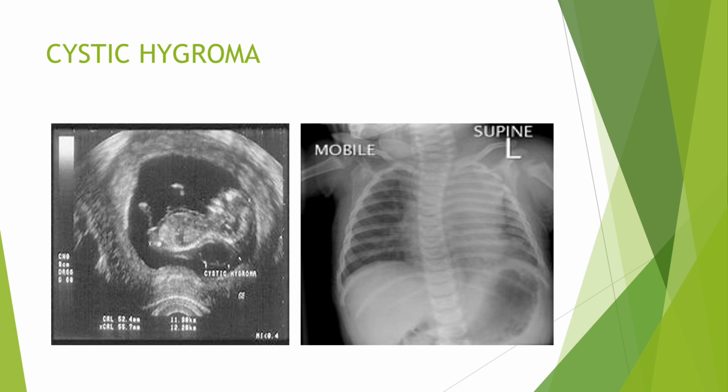While the picture on the right side is a chest x-ray showing an area of increased density in the left cervicothoracic area, and that's suspicious for a cystic hygroma in a young patient. You can verify this also by ultrasound, and it will show you tortuous dilated cystic structures.